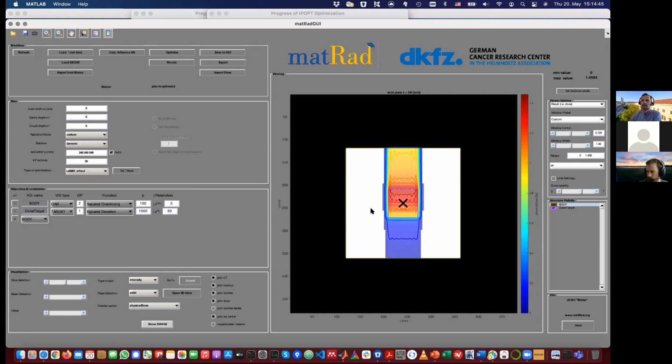So now this is the physical dose, which is now much higher than before. Before we had a physical dose that peaked around, I think, 0.9 gray. So it was below 1 gray. And right now, the physical dose is much higher in this case, right? So if I change the tissue type, what was happening here is that it led effectively to a lower RBE, because now the optimizer needs to apply a higher physical dose to achieve the same RBE weighted dose of 2 gray.